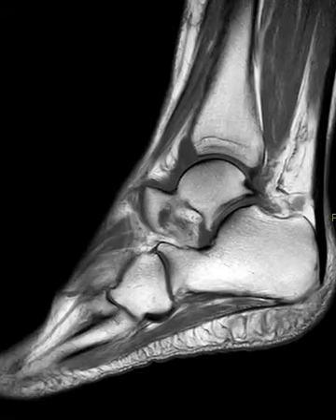Hello, this is Dr. Gay from First Look MRI, and this is a 51-year-old female with complaints of foot pain, no injury. And on this view we see a couple findings.